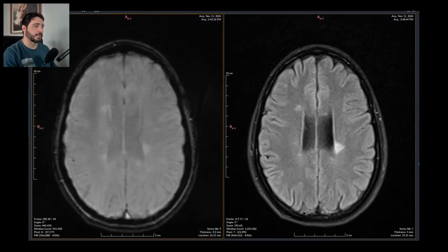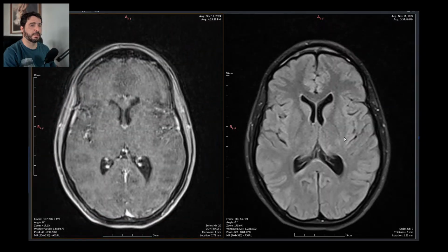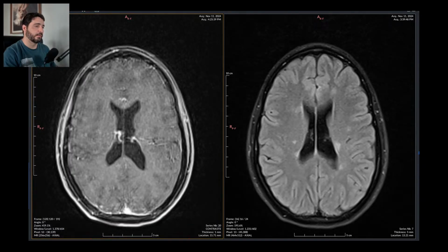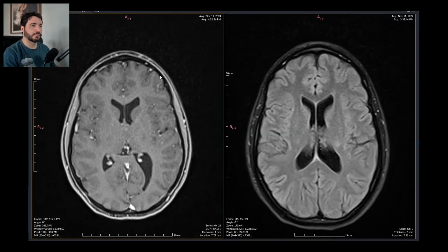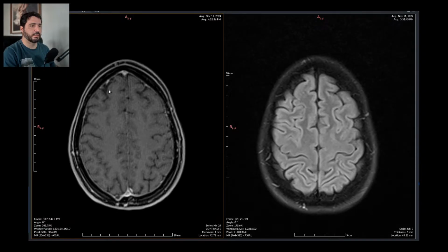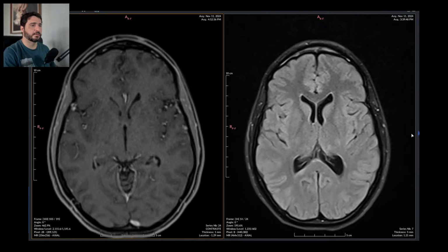So, and no signs of bleeding. And then we have a volumetric T1 that is shaky throughout, and we can't properly evaluate. So they did it again, and it's still kind of shaky, but we can see if there is a very acute enhancing lesion.